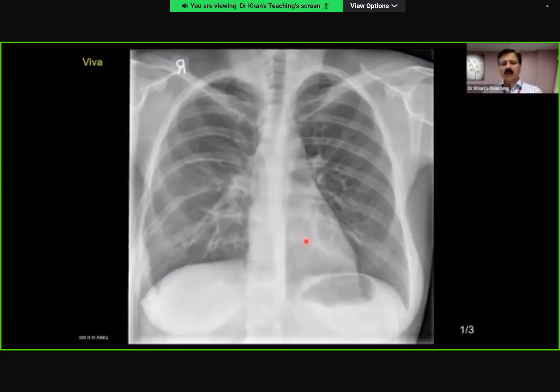Okay, last few films are left, and all of these, except for one odd one, are classical 2B films for observation. So this is over to you.